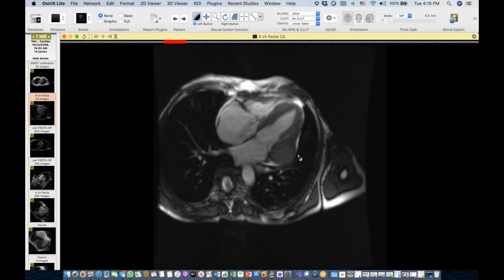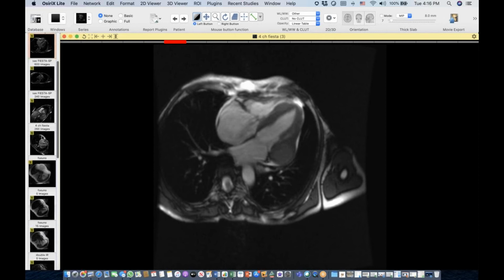There's another interesting finding. There's a large right atrium, and here we see there's definitely evidence of tricuspid insufficiency. So we have tricuspid insufficiency, but there doesn't seem to be mitral disease, even though this mass is, if anything, putting some mass effect upon the posterior mitral leaflet. So keep those things in mind. Let's see now. I want to show you something else.